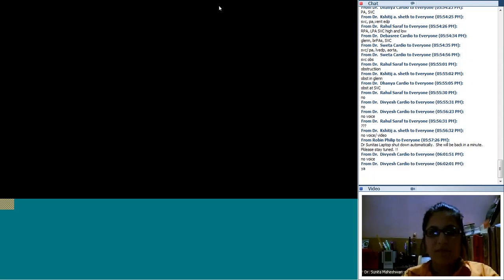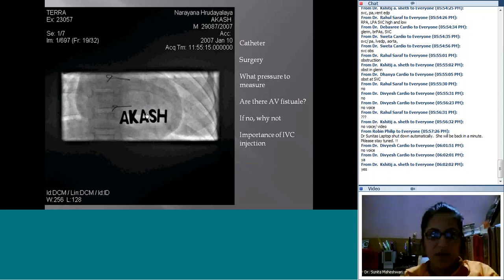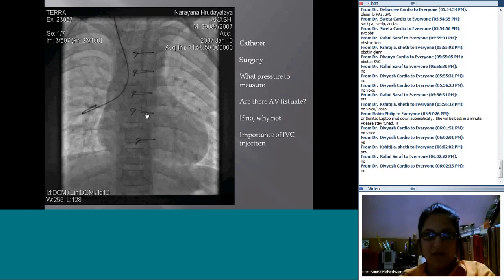Okay, so we were saying, does this patient have AV fistulae or not? If not, why not? So are there any AV fistulae? Are there any AV fistulae in this patient? Yes, no. Watch that. So there are no AV fistulae, and the reason you say that is because there's no rapid fill of the atria.